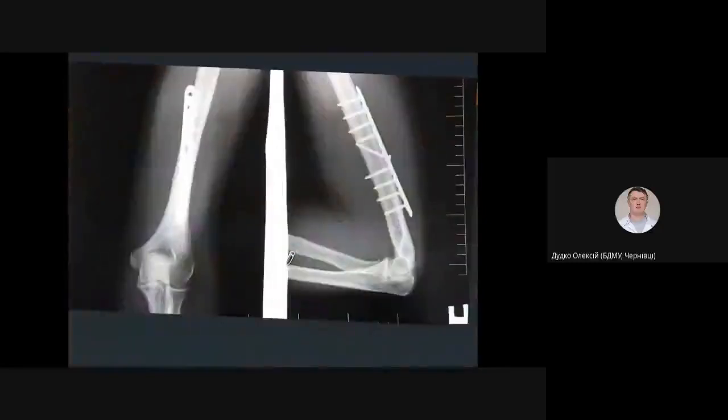So that is another example of an upper limb fracture that was operated already. Again, we should check that this is the AP view, that is the lateral view, that is the elbow joint. We check articular surfaces. These are okay.